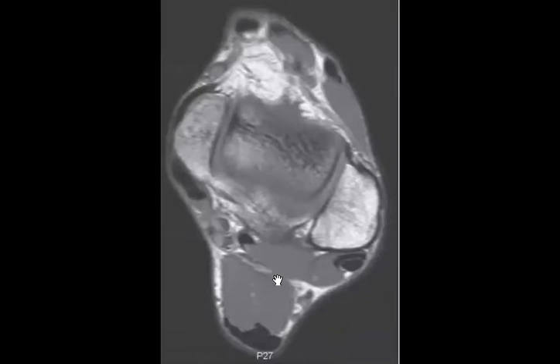So it comes at the level of the tibiotalar joint, and you can see muscles like flexor hallucis longus and peroneus brevis, and posterior to these you can see this accessory muscle. And when you see the normal, you will find the fat bed here. So when you recognize this, then it is an accessory muscle. Yes, perfect.